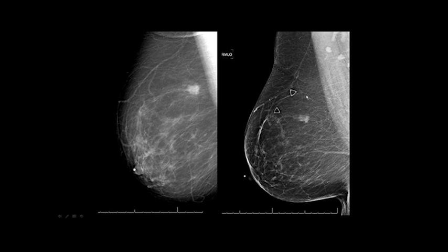This technologist gave the patient good instructions. They positioned beautifully, wide superiorly, muscle pattern with the convex down to the level of the nipple. You could draw a 45-degree line here. You can see the IMFs on here, and it's open.